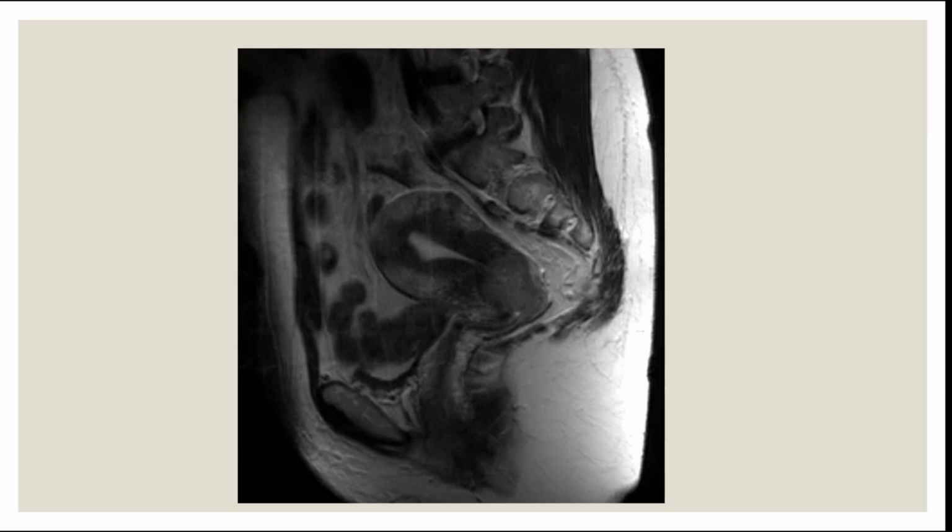Tell me which modality of MRI. Everything from now on will be MRI. Which modality, which organ system, and what do you expect? You don't really have to tell me the exact diagnosis, but what do you expect? So this is MRI, true. Which organ system is this? Or what can you see? Which organ or structure can you see?